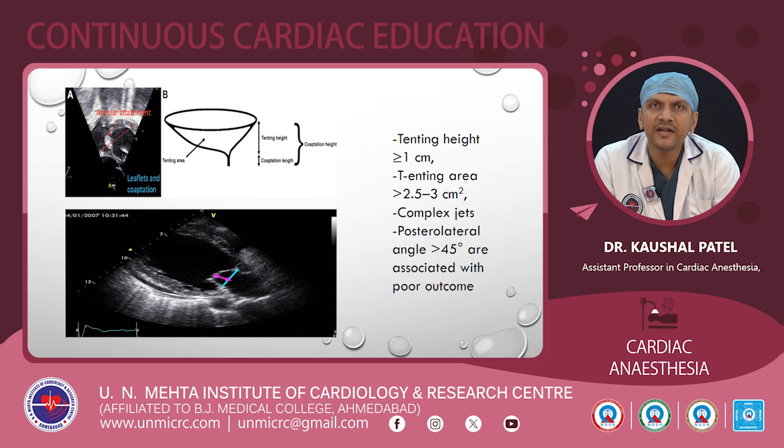The point at which the anterior mitral leaflet and the posterior mitral leaflet are attached to each other, that length is the coaptation length. Okay, and the area between the coaptation point and the annular plane is the tenting area.